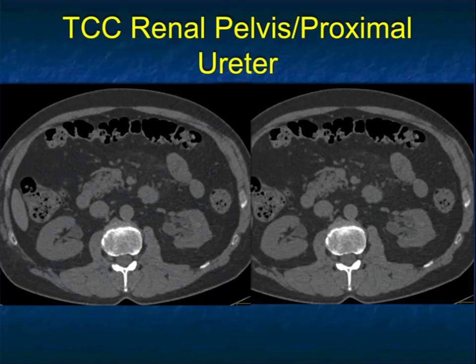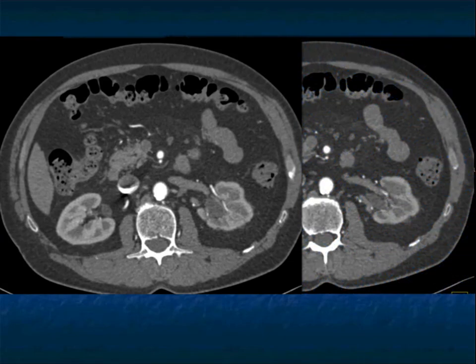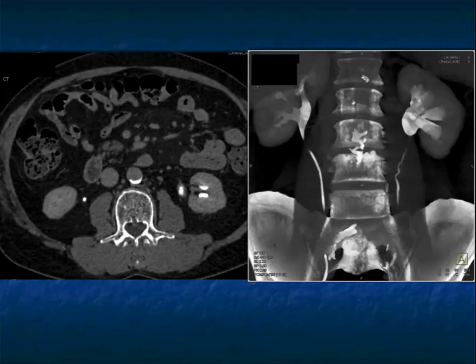So some examples. Here, something is definitely wrong in the non-contrast with the left kidney. There's some scarring, a loss of cortex. There's fullness by the pelvis. And when you give IV contrast, the enhancement of the left kidney is less than the right kidney, and also its borders are irregular. So you're suspicious something is going on. When you look at the recons, at first glance, it looks like a left UPJ, maybe even a right UPJ. The right proximal ureter is not filled for a short segment. When you look a bit more carefully on the axials, you see that there's thickening around the proximal ureter.